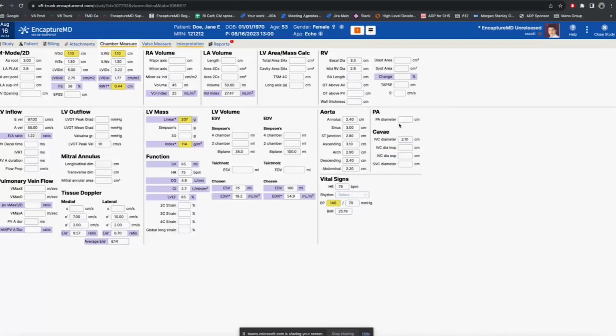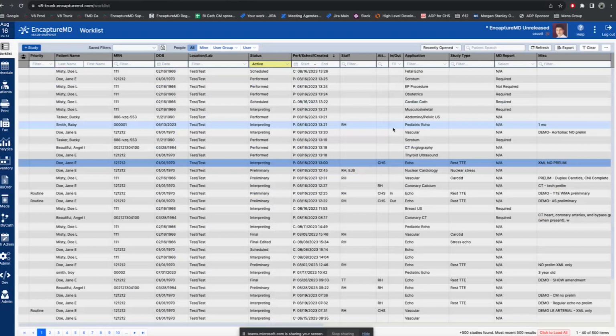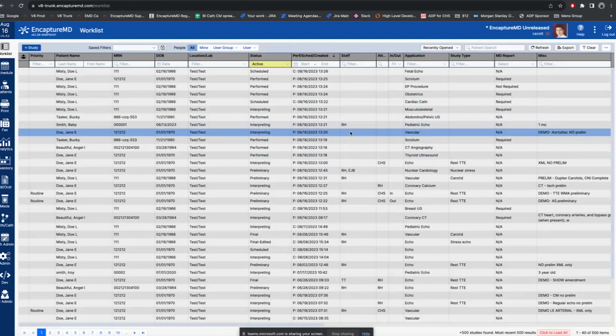So there's some other minor stuff here, but I think that covers sort of the flavor of echocardiography. I'm going to move on to vascular study, and we can talk about those next. So we're going to close this one. And normally it would have closed back to the setup, but I didn't actually sign that one because someone may ask me to relook at it.